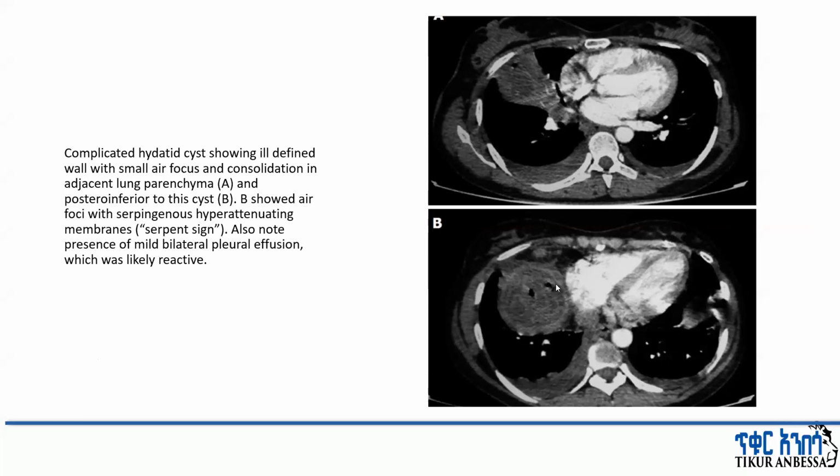These are patients with complicated hydatid cyst, with consolidation and bilateral pleural effusion. This patient definitely presented with high-grade fever and chest pain, which could be confused with other conditions like simple community-acquired pneumonia, but CT could solve the problem.